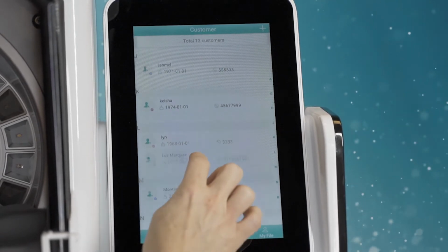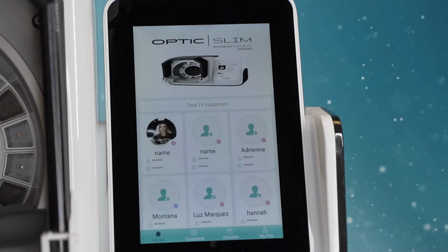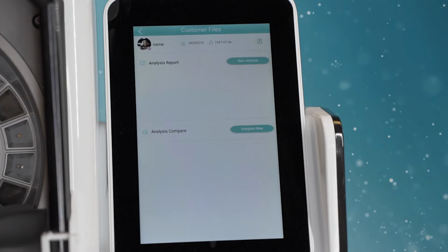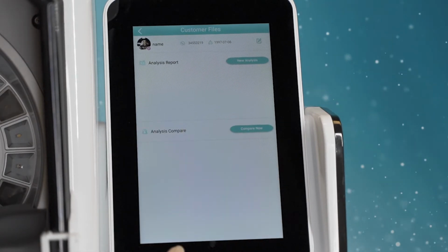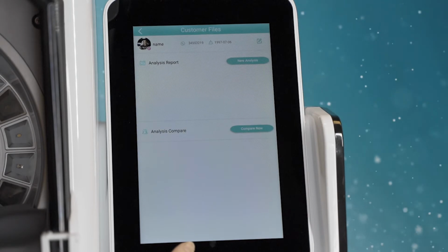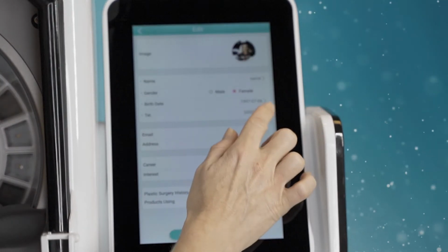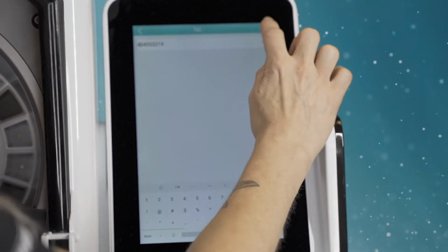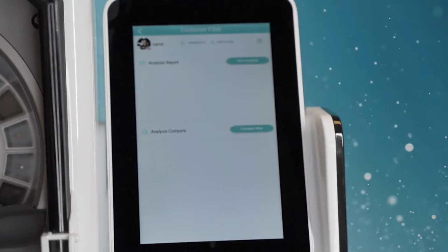It's going to save into the list. This is alphabetical. I can go down to here, find that profile. If I go back to home, it's saved right to the front of the line. Go into that profile, completely empty, ready to start building out. If I need to modify any information about my patient, I'll go right here to the little green pencil, and from here I can modify any of this information I need to update. Press the check mark, press save, and now the information's updated.